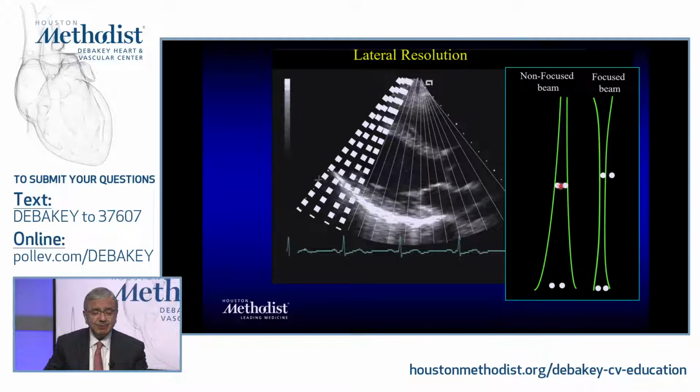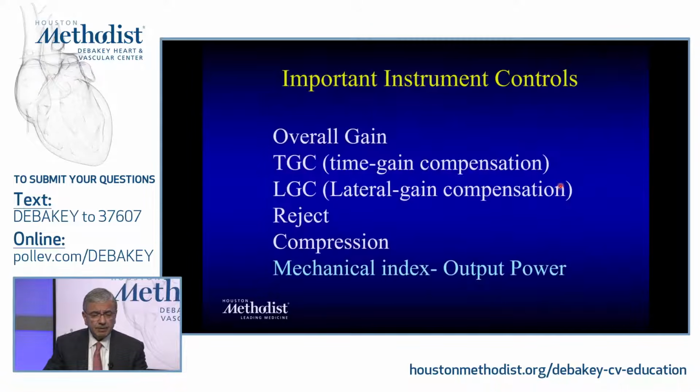I'll give you an example of lateral resolution issues. When you measure the surface or the volume of a left atrium, which is very far down from the apical 4-chamber view, you're going to see a haziness in the border of the atrium, and some of it would reflect back into the left atrium per se, and that's part of the reason that left atrial volumes, the way we draw them, are smaller than those obtained by CT or MRI.